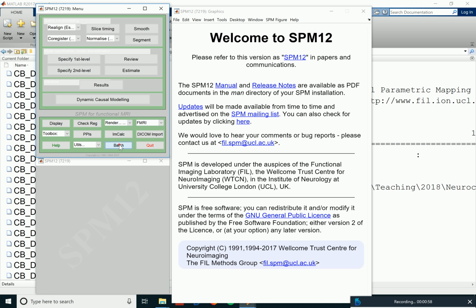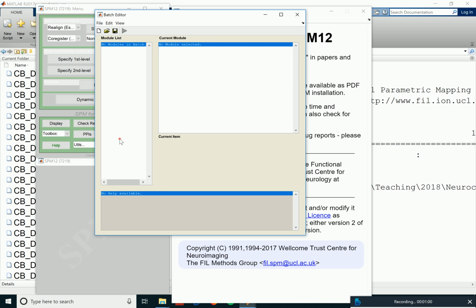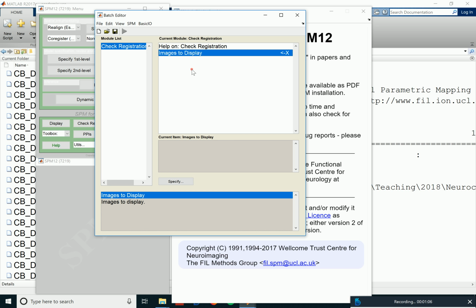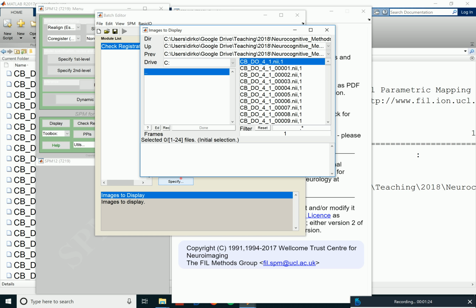So if you were doing this, what you should do essentially is, after you did some pre-processing of a single participant and maybe of multiple runs of that, you should have a look at the images. And as I said, you can also, of course, automatize that using, again, the batch editor and how to write scripts based on that.